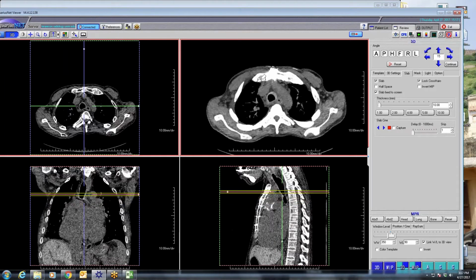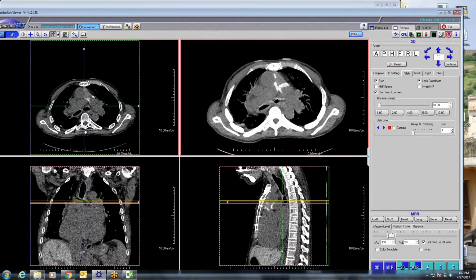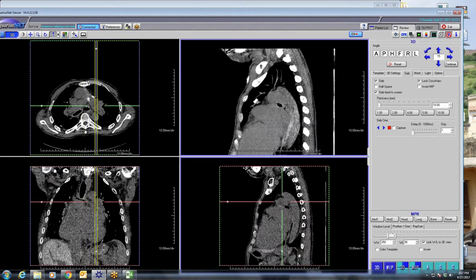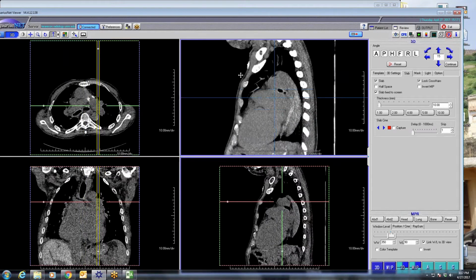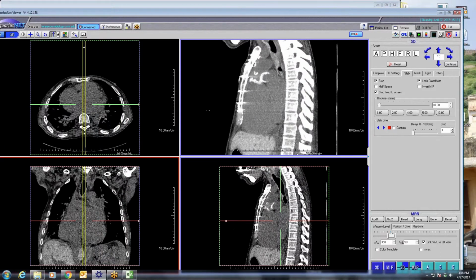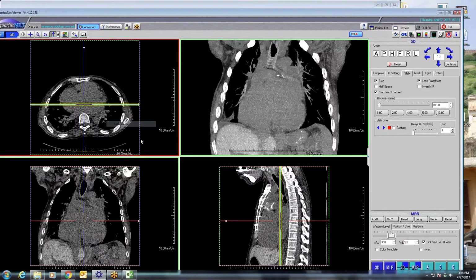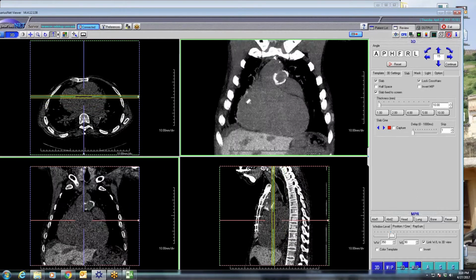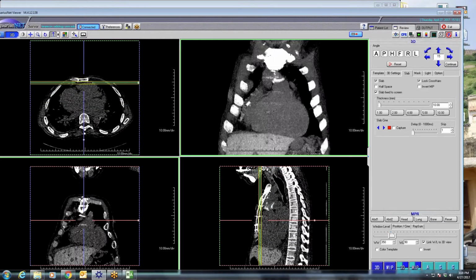Really? And the thing is that when you see dense lung tissue or you see dense skin like this, it indicates presence of iodine, but it doesn't indicate pathology. So any atelectatic lung that is stained with amiodarone is going to be very dense, but it's still just atelectasis. So the high density just indicates presence, not pathology. Interesting.